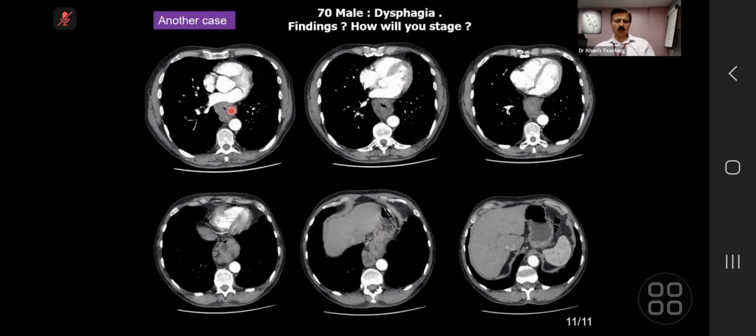Okay, so concentrate on these 3 slides. Esophageal carcinoma staging. So there is contact with the descending thoracic aorta of about 45 degrees. It's also inseparable from the left atrium. What is your conclusion? So T4? T4, excellent. So if you divide it here, this will be 90, so maybe it is 90.